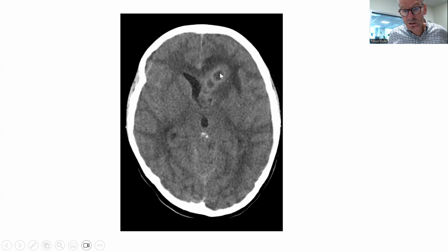It's dark in the middle, so there's more fluid or pus, and surrounding it is an enhancing capsule, as in when the contrast has been given, that enhances with contrast, and then surrounding all of that is oedema. You can see how the area surrounding the abscess is much darker than the rest of the brain. So there's increased water in the brain there, surrounding the cerebral abscess. That's a typical cerebral abscess. You also can't see the left lateral ventricle here. It's been obliterated by the cerebral abscess. You can see the right lateral ventricle, but not the left one.